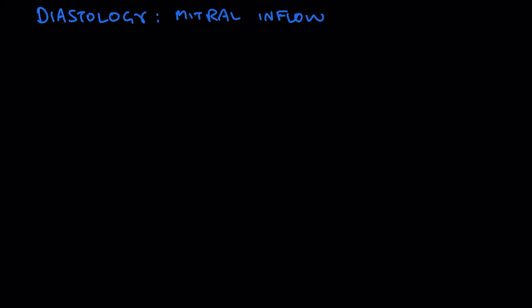Hi, this is Stephen, and in this video we'll continue our discussion of parameters that are useful in diastology, or understanding how the heart fills. And this time let's look at mitral inflow, the flow of blood through the mitral valve into the left ventricle.